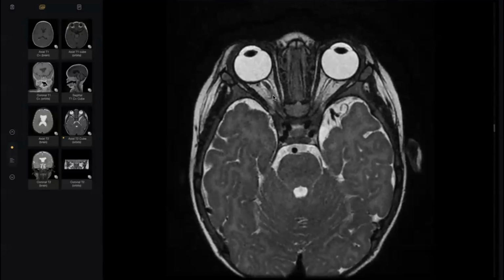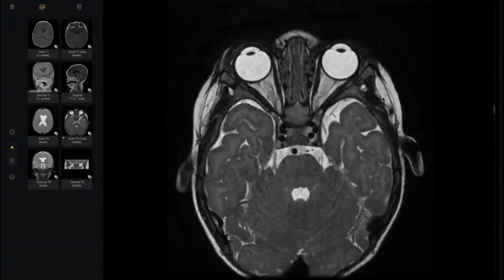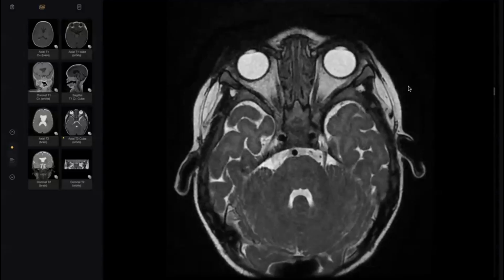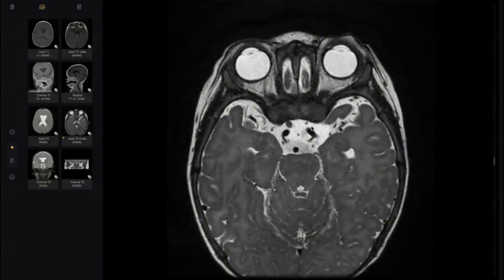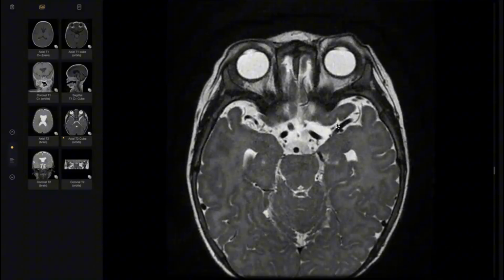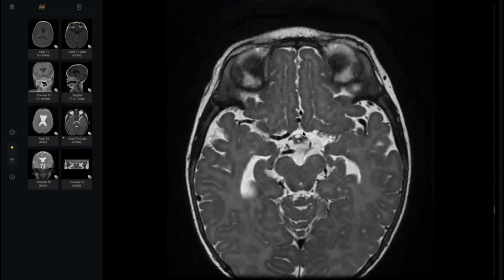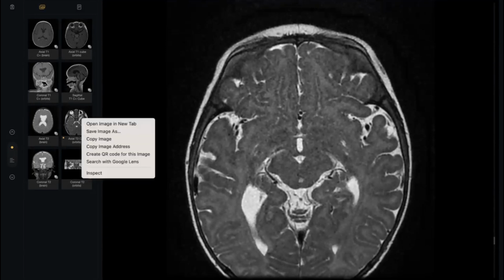See, my colleague here. This is the right optic nerve. Leave the mouse, please. This is the left one. Big difference. Follow both of them. You will confirm your doubt. See, doc. Yes sir, this is the right optic nerve. This is the left. Yes, marked atrophy. Even the optic chiasm here is normal. At the right, here is markedly atrophic.